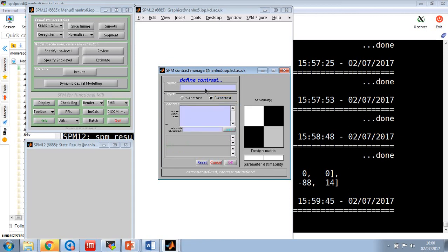the difference. But if we create an F contrast, it allows us to do something slightly different. It's called the effects of interest contrast. It's something that used to be created in SPM by default, but it's gone. But it was quite useful for plotting. So if we do 1, 0, 0, 1, we're asking, show me any brain region, it's an F contrast, so it's bidirectional. Are there any brain regions which respond during condition 1, group 1 basically, or respond to group 2? I'm not comparing them here. But the key thing is this contrast has two bars, one reflecting the first column, and the second one reflecting the second one. So when we plot using this contrast, we'll get the two bars that we want.